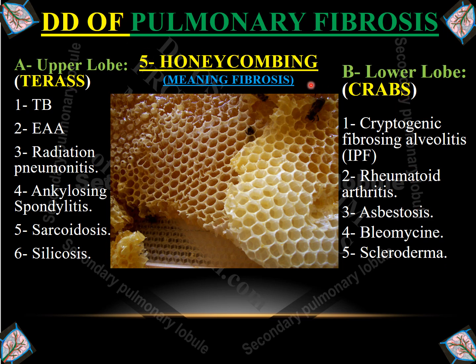So the honeycombing appearance is the end stage of pulmonary fibrosis. According to the concomitant data and findings on the film, we can reach the differential diagnosis as we discussed.